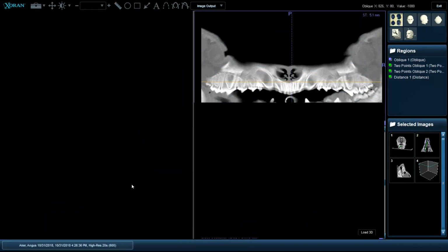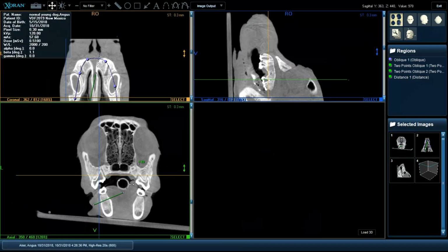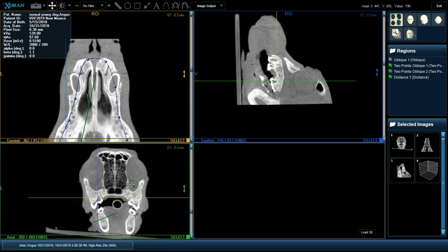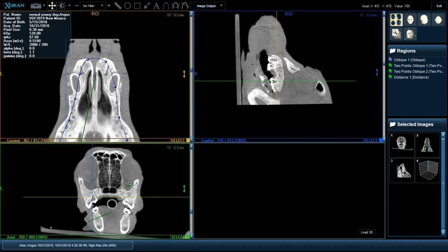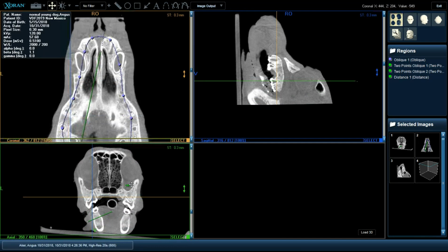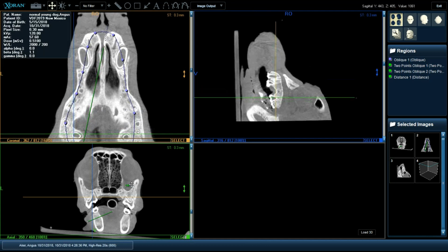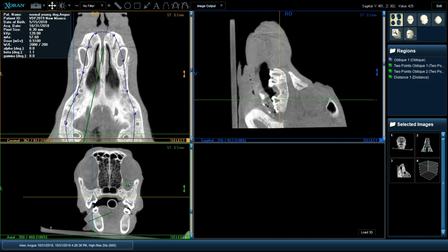And this is the sort of image we would first initially visualize. And just to give you orientation, we have the axial view, so the front to back cuts, coronal view, which is sort of looking at the patient from the top or bottom, and then the sagittal cuts.